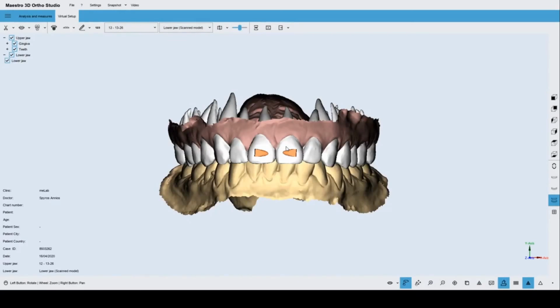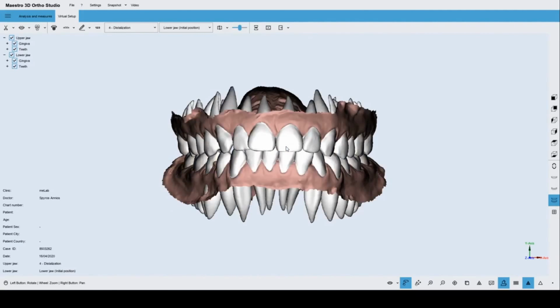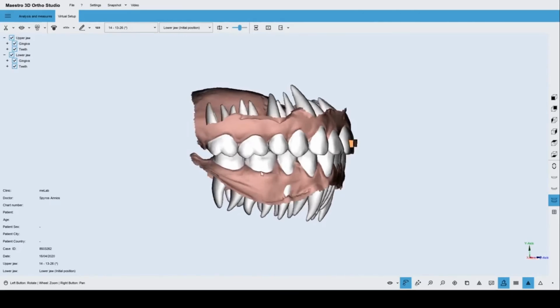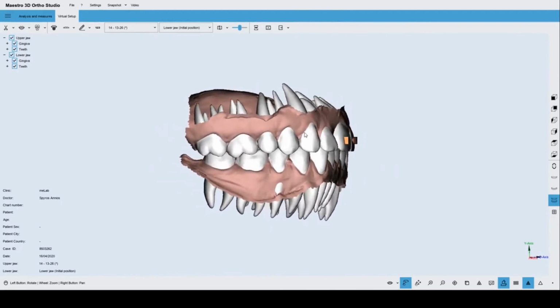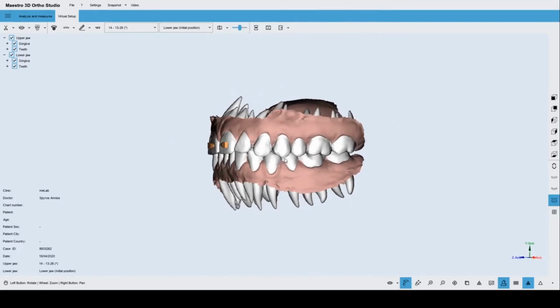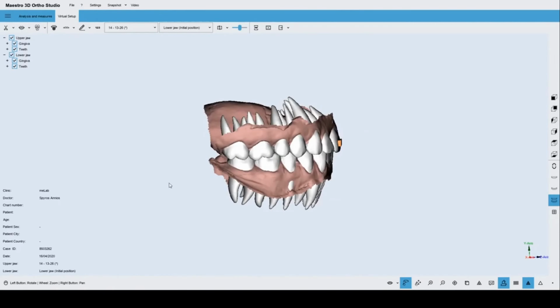and right now I have, you see, the sequence of models obtained for this particular case. And now the last step will be to prepare the models for the exporting, and we will finish our presentation.